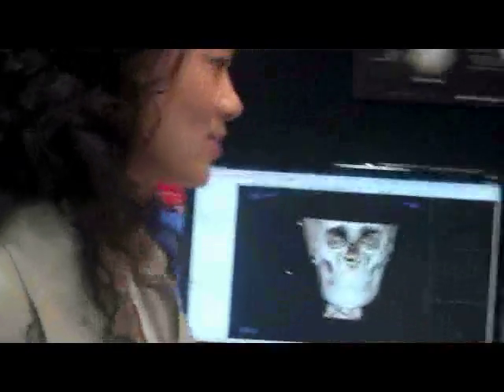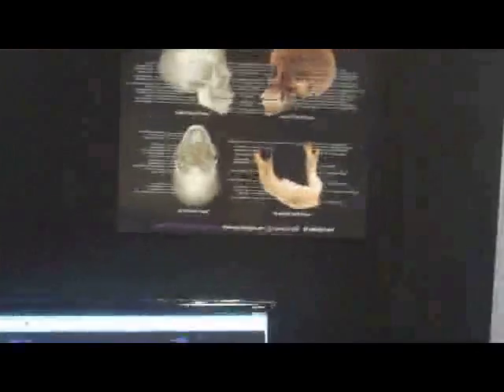YouTube. So here we are today at Anatomage, and we have Dr. Grace. Hi. Hello, everybody. And we have Brendon, who is the top tech at Anatomage, and he really knows how to show you how easy it is to do cephalometric tracing.